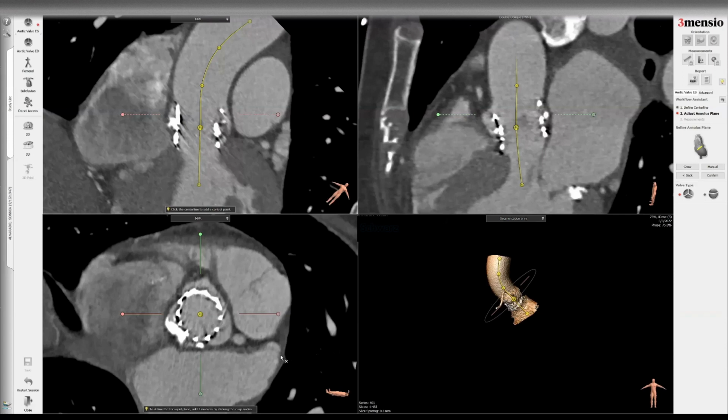First, it's important to get some records information ahead of time. Number one, we like to get the pre-TAVR CT, the CT the patient had before the first TAVR, to check the native aortic anatomy and measurements, to see whether the valve is properly sized and whether there is any hostile anatomy that would increase the risk of PVL. We also want measurements such as left main height and sinus height, which give us a reference for the annular plane on the new CT, because with the transcatheter valve in place, it's almost impossible to get the true native annular plane unless you have some reference landmarks in place.